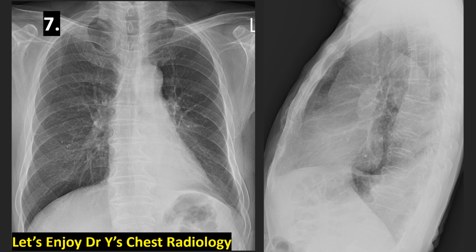And if we trace the large airway from the trachea, carina, left main, and left lower bronchus, there is a blind pouch at the left lower bronchus. This is left lower lobe collapse due to lung cancer. You can confirm it with the lateral film on your right side. Yes, the left diaphragm posterior portion is elevated and obscured, and there is increased density on the posterior inferior area.